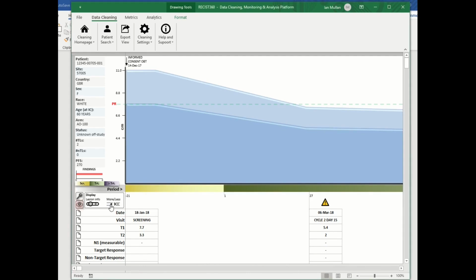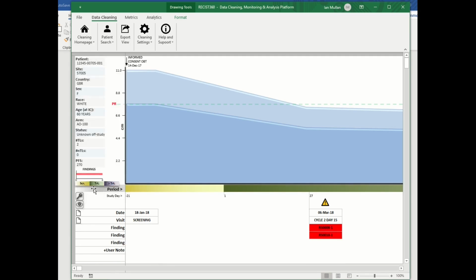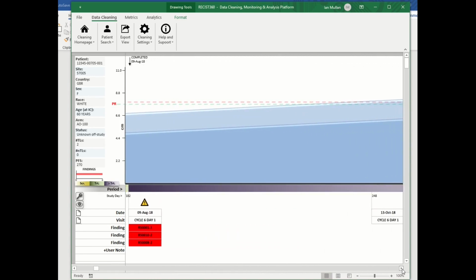As mentioned, we can adjust the quantity of information on the view. We might do this if we want to only see the programmed findings and user notes. The power of this tool is not only in bringing complex data concepts into an interactive visual, but also the fact the program scans the data for discrepancies. Of course, EDC edit checks and manual data review aim to find data issues too, but this tool finds them automatically and in accordance with published articles.